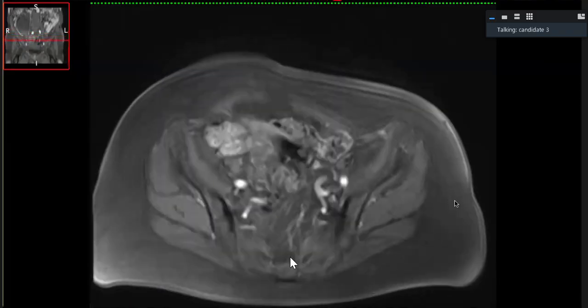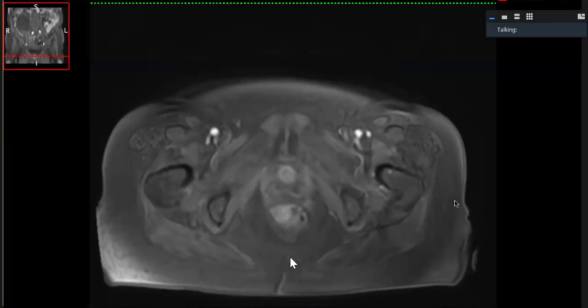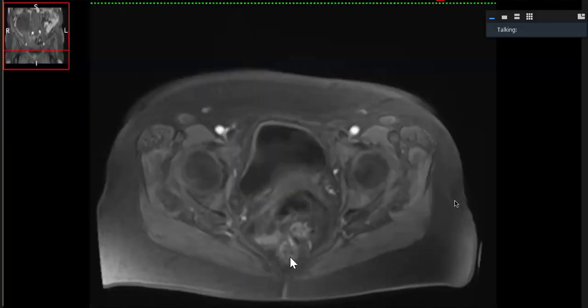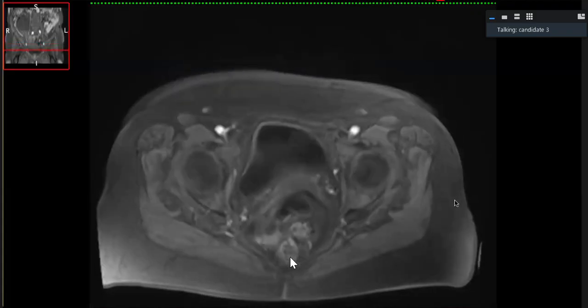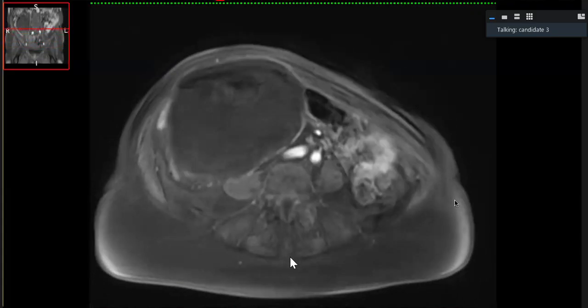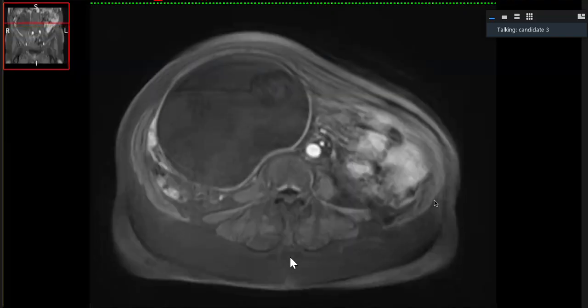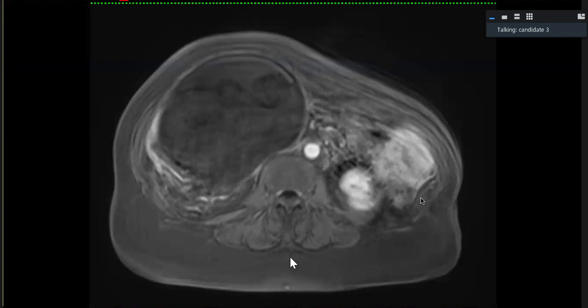And going down further in pelvis, there is slight nodularity, but no convincing solid peritoneal lesion. So it's likely a malignant germ cell tumor in right adnexa, possibly arising from ovary, and should urgently be conveyed to the relevant gynecological MDT for further management.